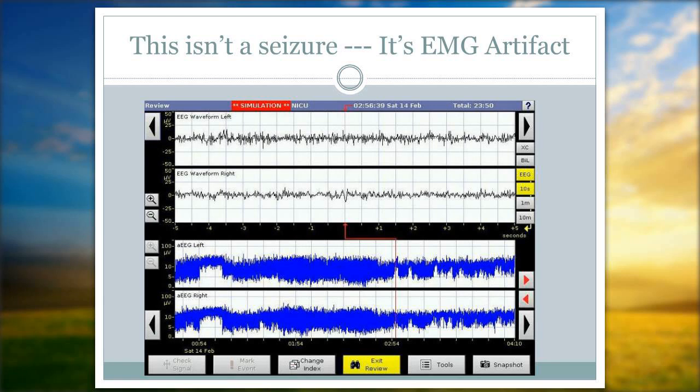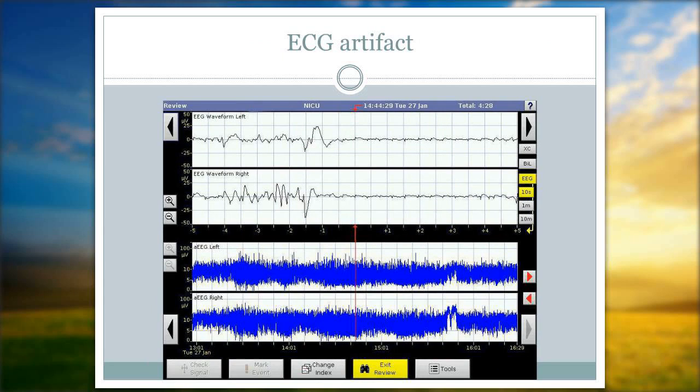Now over on the left at around 0054, there's another massive uprising. I don't know if that's seizures. I don't know if that's EMG. I don't know if it's movement. I don't know what it is. There are definitely some suspicious areas, and even to the right of the red marker, there are some other suspicious areas. All I can say is those are all suspicious, but until you take your cursor and you go in and you look, there's no way to know.